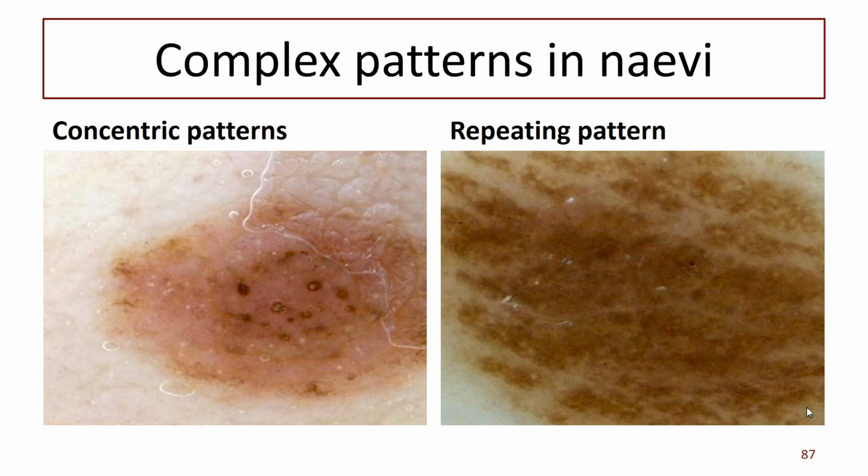They can be multiple structures. If you remember back to this morning where we learnt about compound nevi, that makes sense if you think of this edge here being the junctional component, just on the surface of the skin, and then the central part of the nevus being dermal, deeper cells. And in this case we've got three concentric zones again, making it symmetrical.